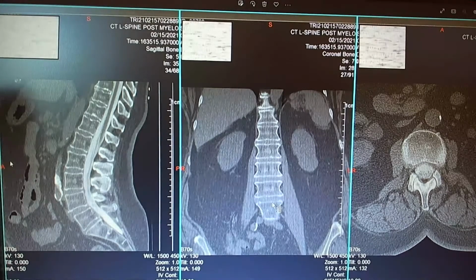Now, what is a big structure? This is the subcutaneous fat, perfect. But here in the belly, we don't have subcutaneous fat. What is omentum? Perfect. That's omentum. And omentum is practically a big, almost like a curtain. Have you seen that in the anatomy lab? It's almost like a curtain.